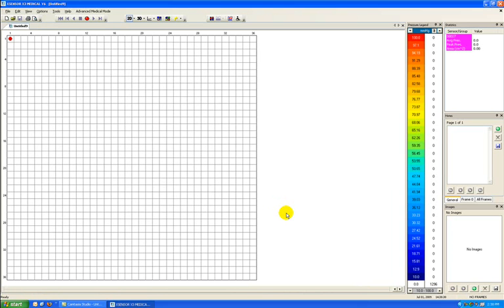I click on OK, and I see my sensor grid. That records the 36 rows across, and then the 36 rows down that are present on my LX100 363602 sensor. The first thing that we want to look for after we've started this session is basic versus advanced medical mode.